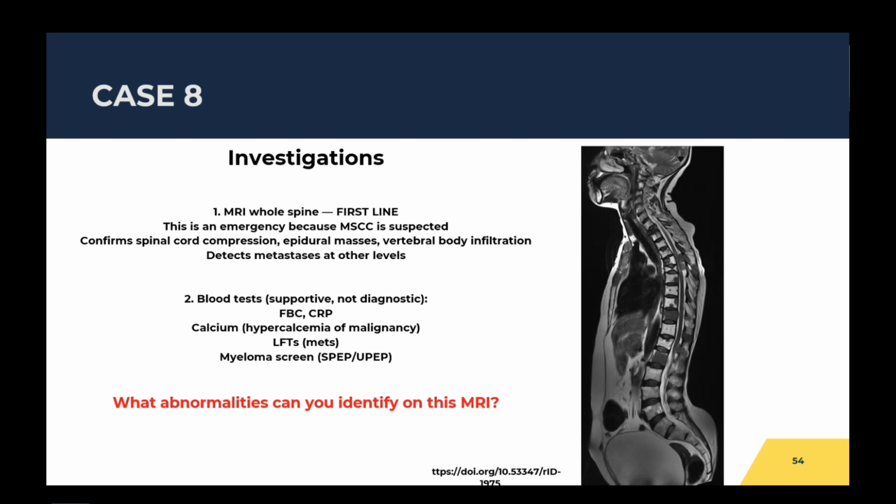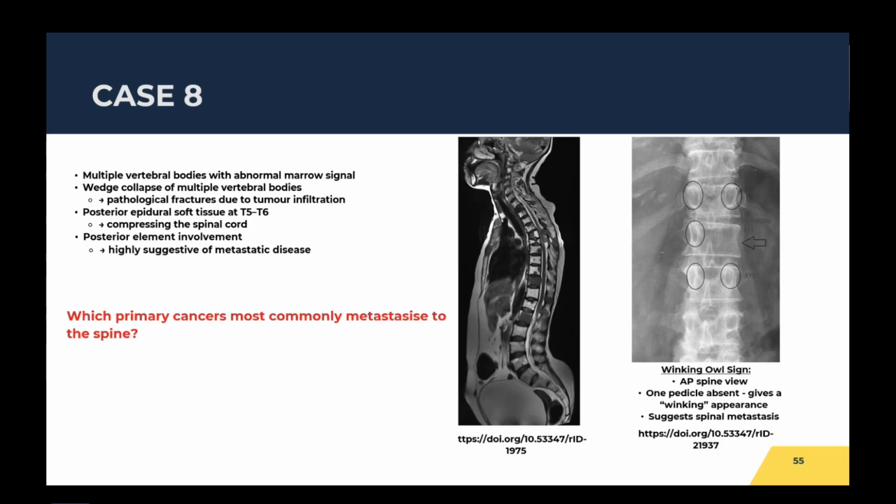So the next question, what abnormalities can you identify on this patient's MRI? Just give it a few seconds. Yeah, wedge collapse, absolutely.